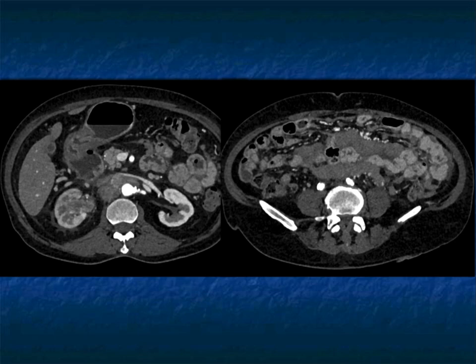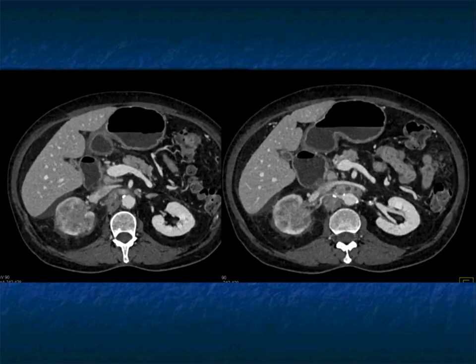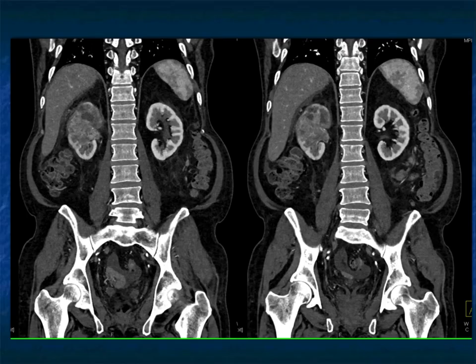The patient has multiple nodes and infiltration into the mesentery and omentum, as well as the right para-aortic adenopathy, which probably makes me again think more commonly of a renal cell. But again, look at the pelvis here. Look at the enhancement of the wall of the renal pelvis. Look at the infiltration in the kidney. It does make the point that transitional cells can have adenopathy, can go to the omentum, can go to the para-aortic region, as you see here.